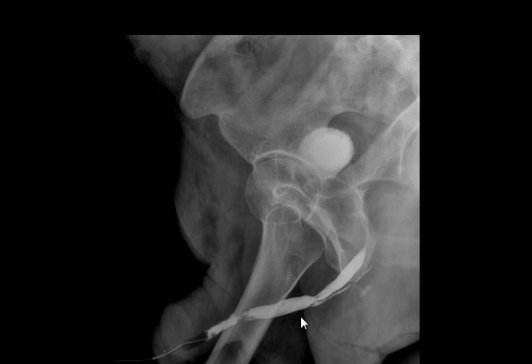However, is it by accident that you have this at the same site as a second narrowing? No, it extends from the membranous to the bulbous, but I can see two strictures. It's more anterior, more in favor of infection rather than trauma. Trauma is more posterior. It won't be trauma because it's multifocal.